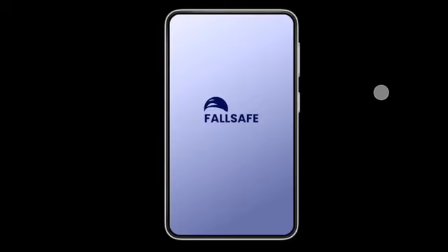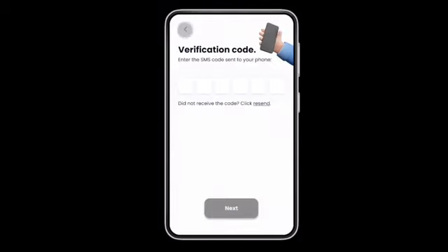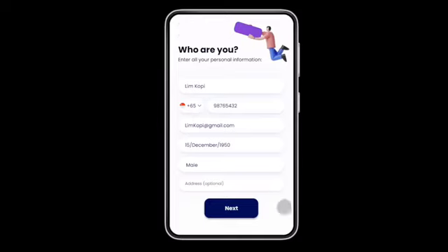This is our wireframe of how we want our mobile app to look for the actual product. This is the startup screen, FallSafe. Upon entering as a new user, the user has to enter their relevant details. Once they have completely filled them up, they have to click the next button. In the event they realize they have entered the wrong details, they can click the back button here.